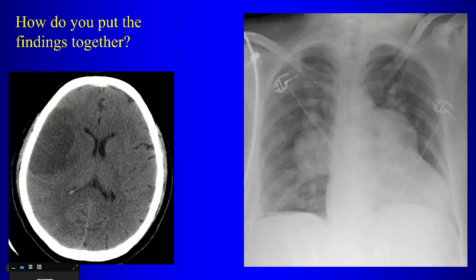There's a chest X-ray here. Do you see that with a PFO? So you're going to go with what? ASD. Yeah. So ASD, which then resulted in Eisenmenger's. Of course, PFO can give you paradoxical embolism, but that's not going to give you this appearance of the central pulmonary arteries.